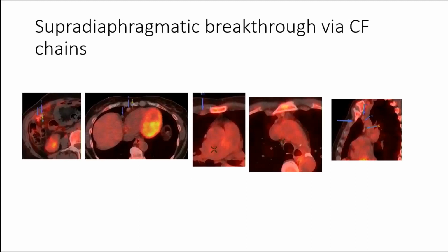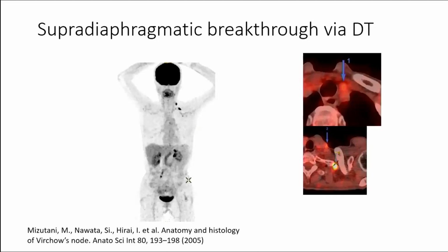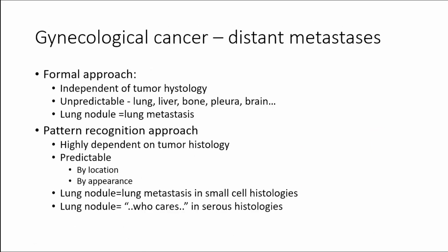So how does the breakthrough take place? On the first picture, we see the peritoneal carcinomatosis. The breakthrough to the cardiophrenic spread is on the second. We have parasternal, upper mediastinal lymph nodes, and lower mediastinal. This is the trace of how they go there. So it's very logical. This is another example, supraclavicular breakthrough with lymph node metastasis going two different ways, cervical and to the axilla.